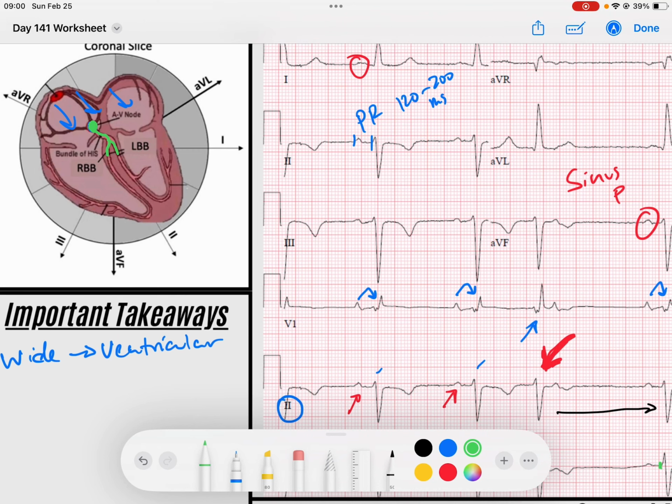Alrighty. And now, the last thing we're going to do is take a look at that QT interval. If you look in between two R to R's, and if I find the midway point, notice my T wave ends by that point, so that's reassuring. Because the repolarization, which is our QT interval, is correlated to the rate, so you can use the R to R intervals. I look for any pathological Q waves and ST and T wave changes. I don't see any active ST T wave changes that make me think of ischemia.